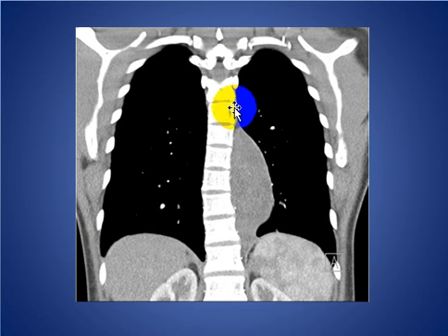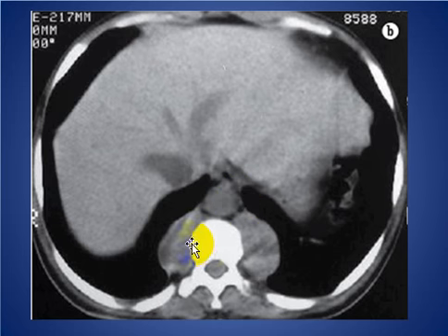This is a large mass in the right paravertebral region, oval in shape with some extension to the upper abdomen, and this mass proved to be paraganglioma. And here we see the liver is slightly hyperdense in attenuation, and paravertebral masses on each side consistent with extramedullary hematopoiesis.